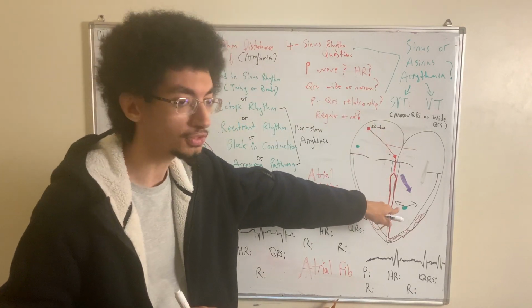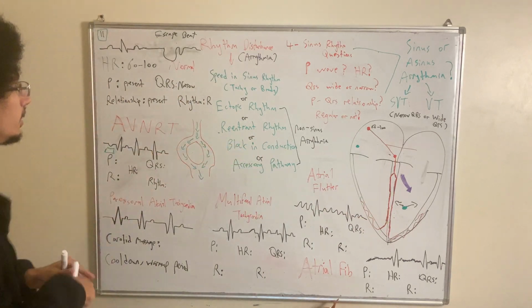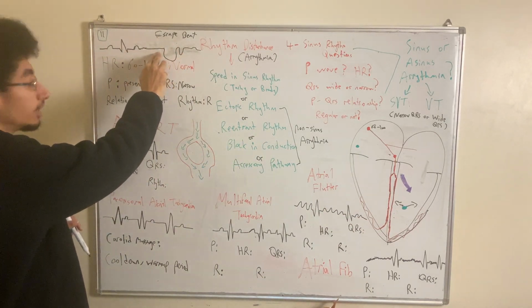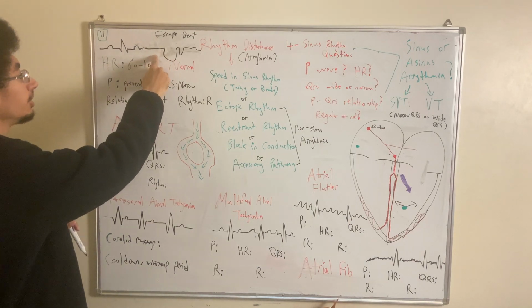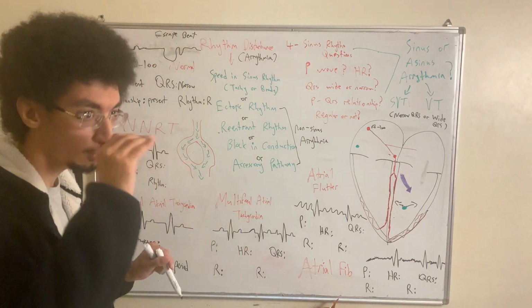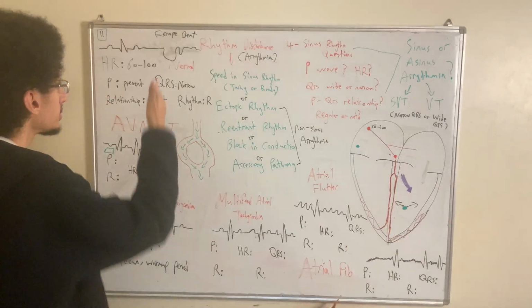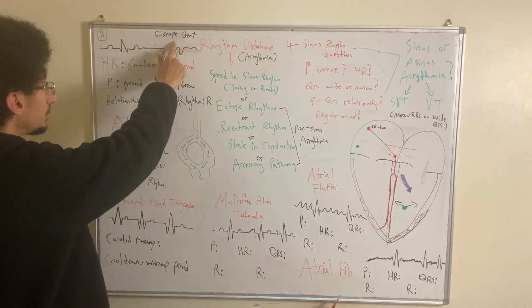It comes exclusively in the ventricles. So, in an escape beat, following a sinus arrest or no electrical activity, you might see a wide QRS complex with no P wave. And this occurs late. This occurs after some time. This is what is known as an escape beat.